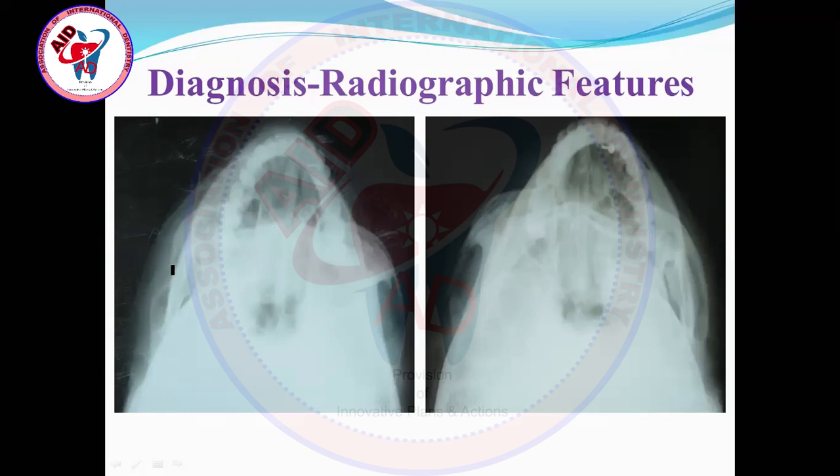This is a triple fracture. This is how it presents on the radiograph: when there's a blow from outside, the arch gets displaced medially towards the infratemporal or temporal fossa, and here is the fracture in the middle, here is the fracture anteriorly, and here is the fracture posteriorly. Triple fracture, three fractures. And when there's a blow, the arch will come medially. Once the arch comes medially, it is a V-type fracture. We have discussed this in the classification.